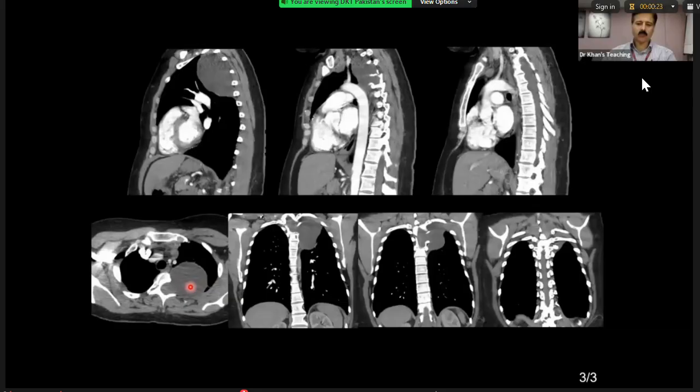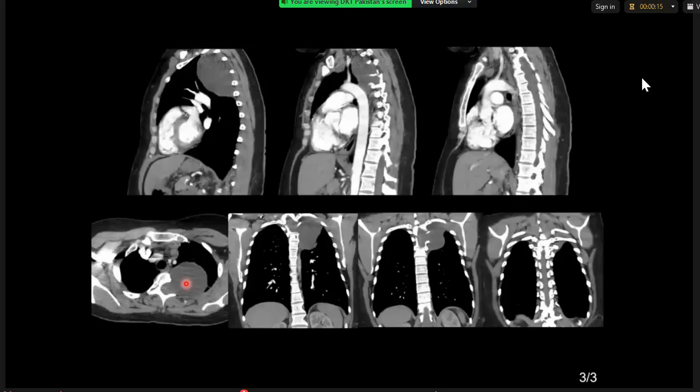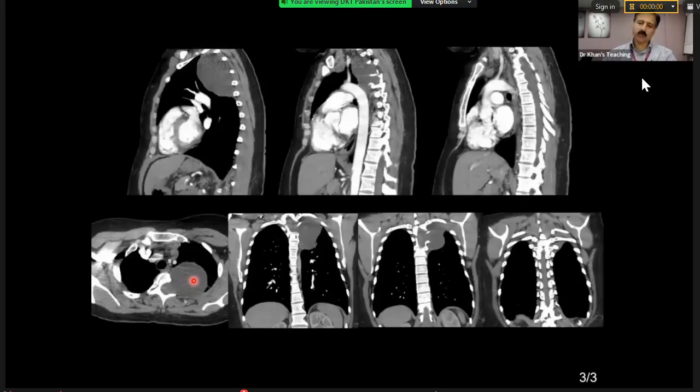Neural tumour? So means a soft tissue mass? Can you do some technique on a CT scan to confirm that this is? I could check the Hounsfield units and also contrast from a contrast. Oh, it's already contrast enhanced, isn't it? So it could be cystic, but sometimes you get cysts within. Okay, so what would you like to do now?